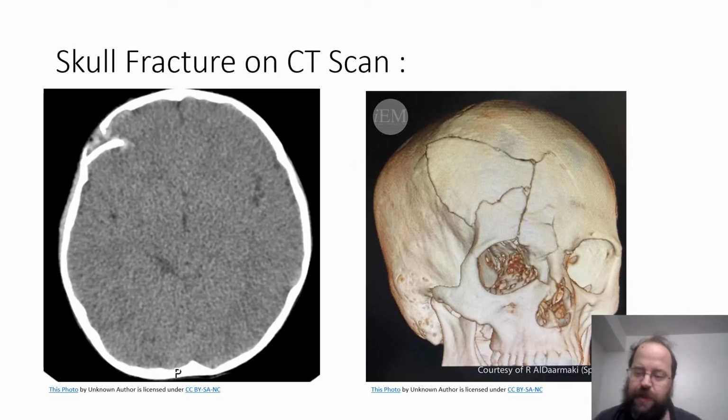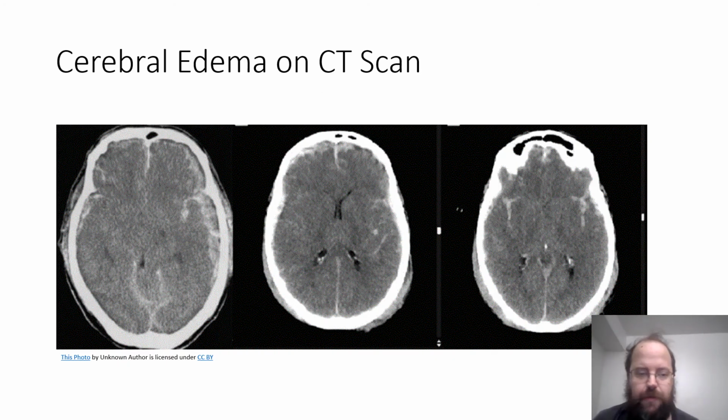All right, the first one is a pretty simple image that, if you're looking at your own images, you want to look for skull fracture. Did you have a skull fracture? Because that's a lot of energy. It takes a lot of energy in a trauma to fracture your skull. Picture on the left shows skull fracture, and you can obviously see in the upper left quadrant, skull fracture.